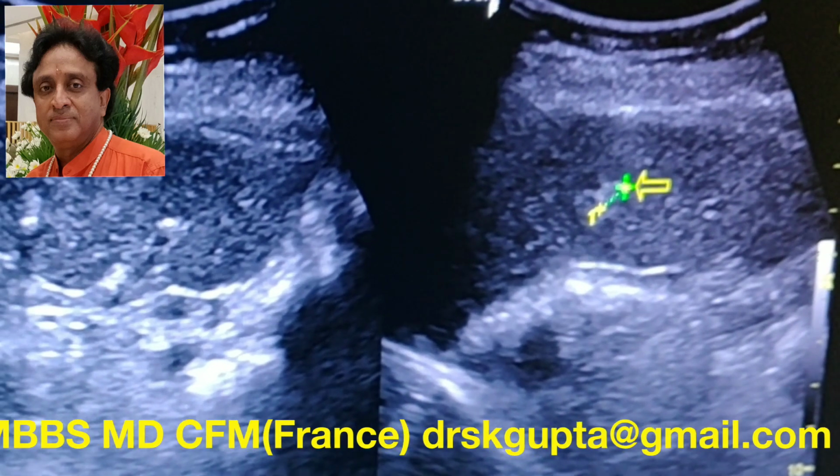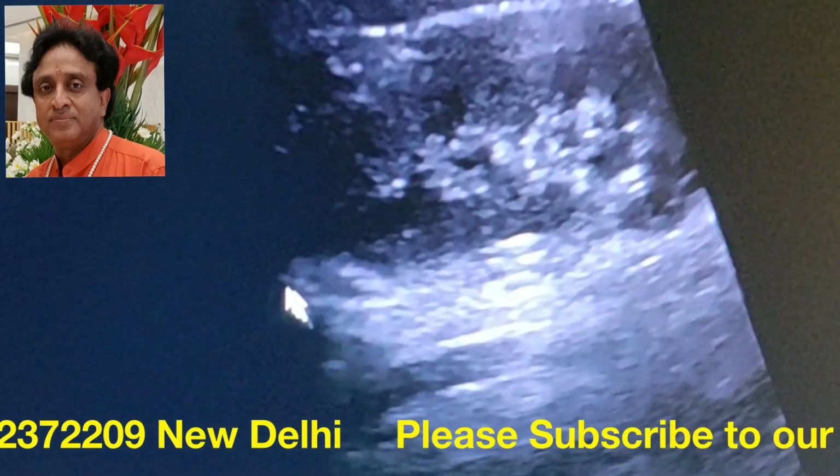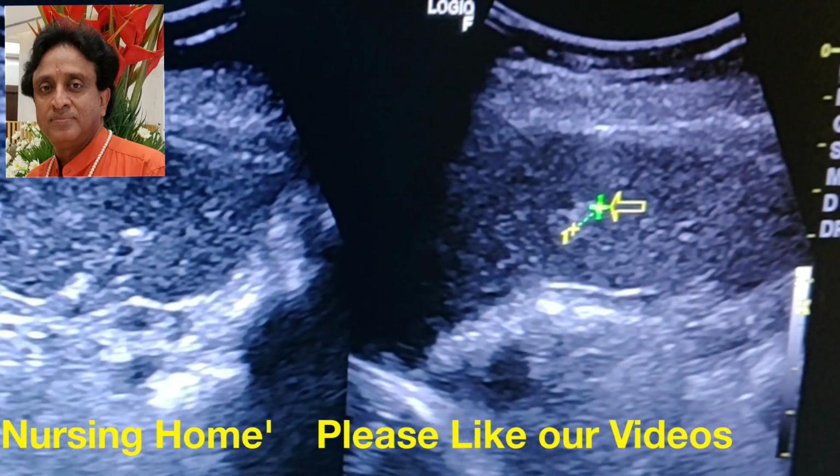Whenever you see the calcification in the spleen, it should be reported. This patient did not have any calcification in the kidney or in the gallbladder, but the spleen definitely showed foci of calcification.